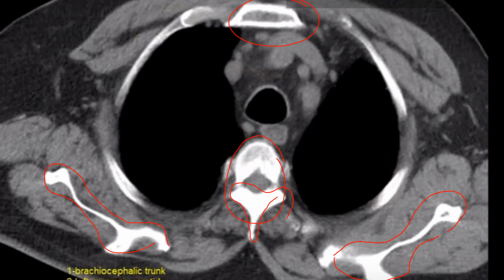That's why you see the sternum and the spine and the scapula are pretty darn radio-opaque. But this other tissue, this light gray tissue, that should be muscle tissue that you're looking at there. So here we have obviously a rib coming around from the spine. So we're pretty high up. Here's the aortic arch area.